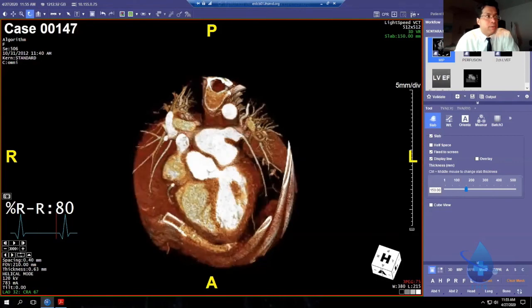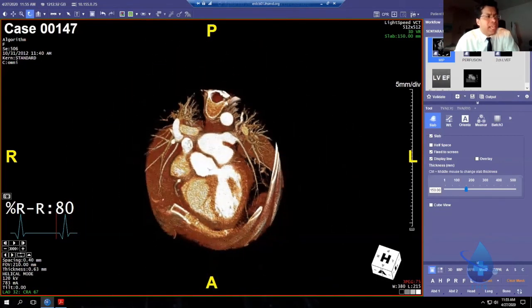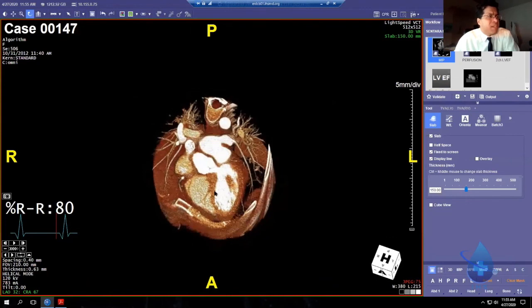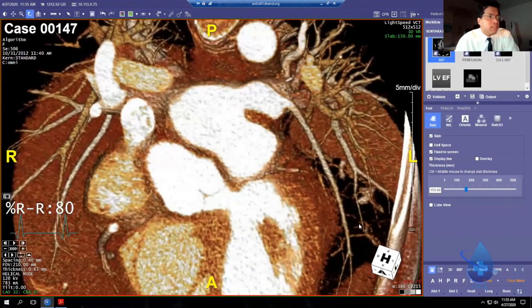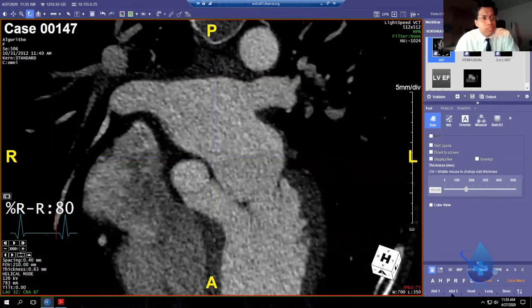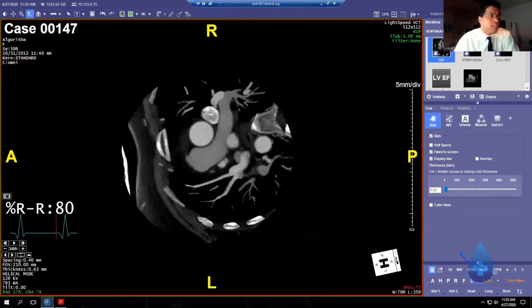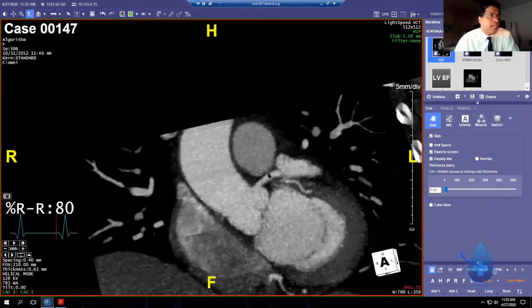Okay, now you push the mouse forward or backward and you can zoom in. The mistake I see fellows make is they read this small like this and they're staring at the screen when they forget that they can just zoom in and look at the pathology, and it's more likely you're going to make a diagnosis when you're looking at it zoomed up than as a small structure. Okay, so zoom in to save your eyesight, and my eyesight too.